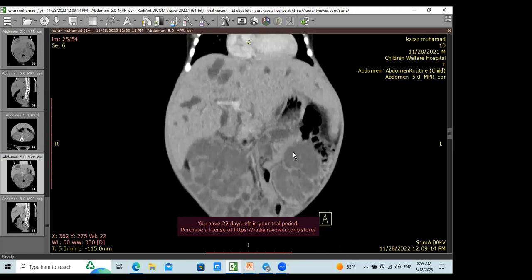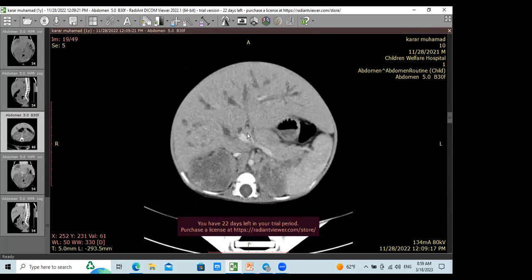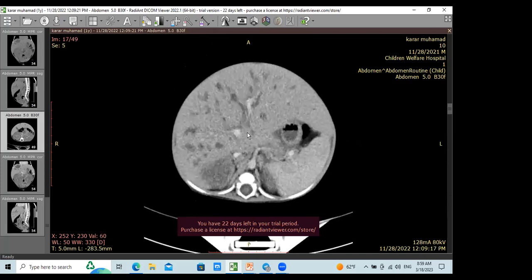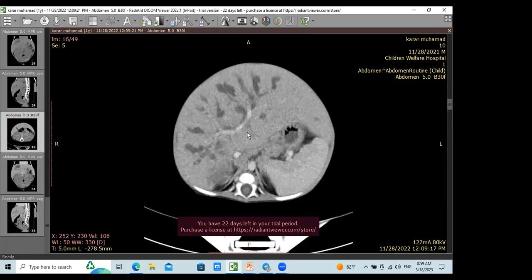Differential diagnosis of this case according to the age. Doctor, we could consider polycystic liver disease, for example. Where is the central dot sign? We saw it on the axial, it is present and clear. Not all of them, but some of them. This is a massively enlarged liver and enlarged kidneys, both kidneys, and severely dilated intrahepatic bile ducts, more on the right side.